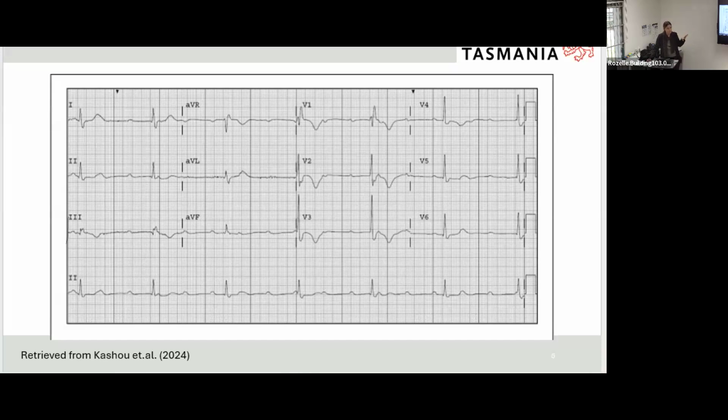Is everyone following so far? Just going to get a general pattern. In terms of looking at our T waves, we know that they're abnormal. So now we need to go back and have a look at our QRS complexes. We've determined in lead 2, we're happy that they're normal. Are they normal across the board, or are they a little bit strange in our chest leads? A bit peaked in V2, V3? Yeah, absolutely, I agree. Anything else from anyone else?